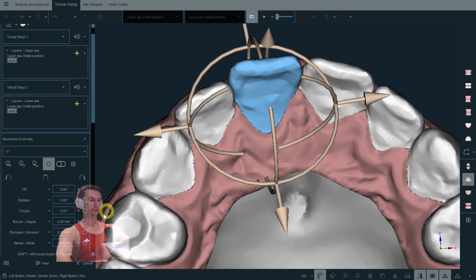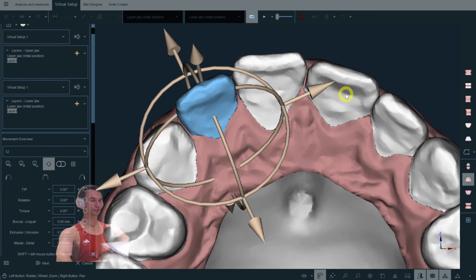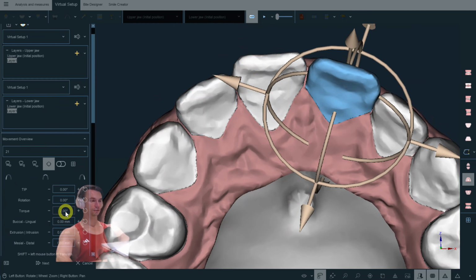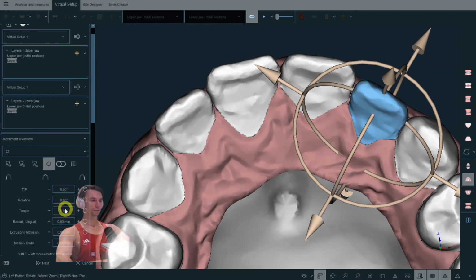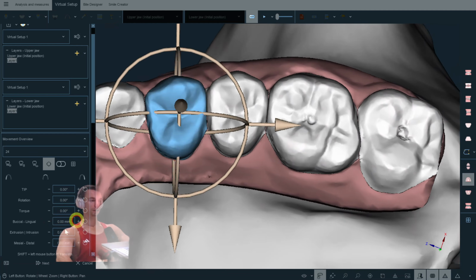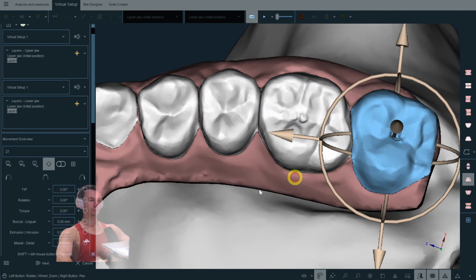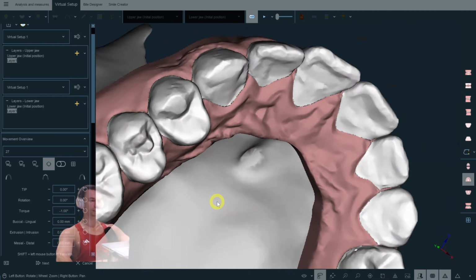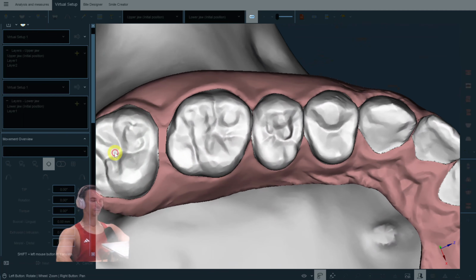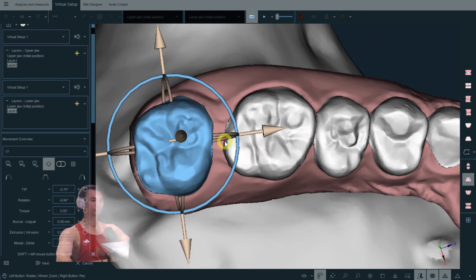At the same time, we can start working with the incisors, slightly moving them forward. And here, also going to expand. Look, I use only 3 movements because it's way more realistic.